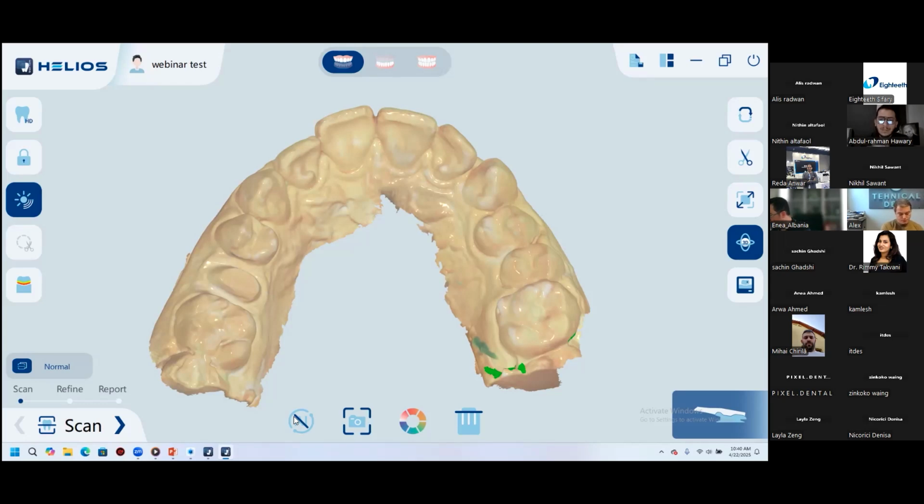No. The scanning time mainly does not affect the occlusion, but like I told you, while taking the bite, increasing the scanning time increases the possibility of having discrepancies. So it indirectly affects the occlusal accuracy. But this is just for the scanning time for the bite. Scanning time for the upper and the lower also increases the possibility of having discrepancies, but doesn't make a huge difference. So there is no maximum time of scanning for the bite scan, and no minimum.